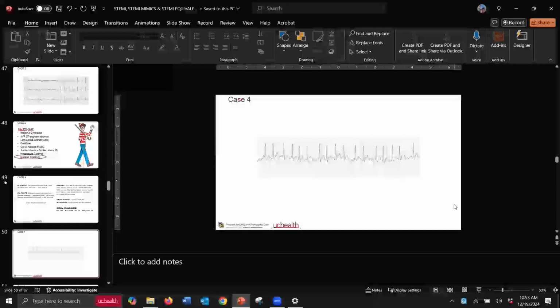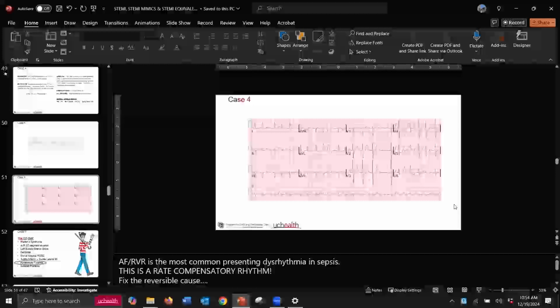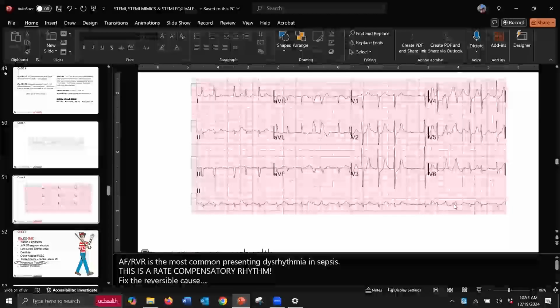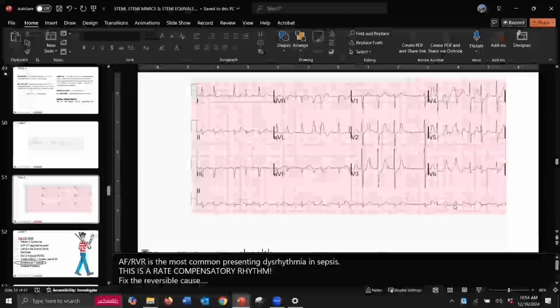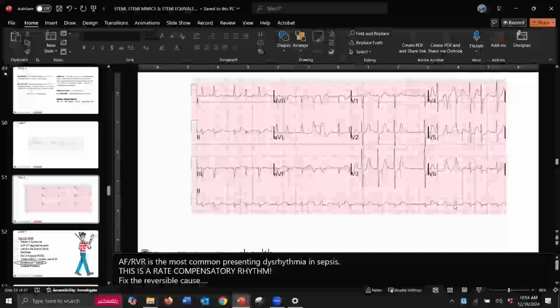What would I want to do? Stroke assessment and get one of these. Zoom it in again. Do you see anything in there you don't like or don't expect?